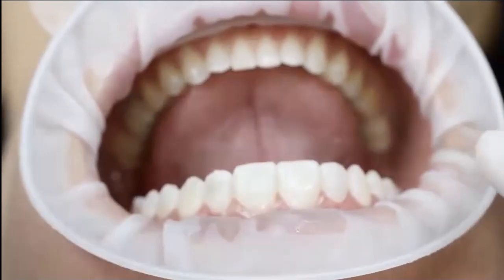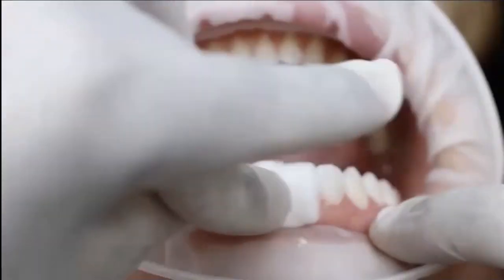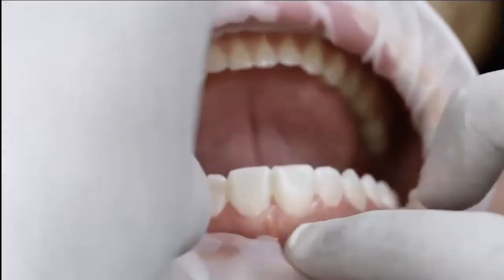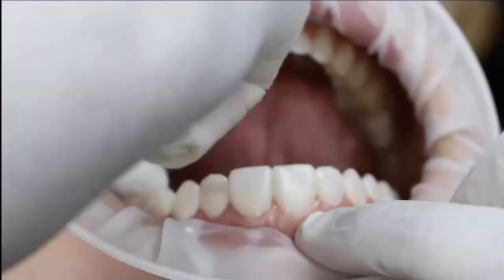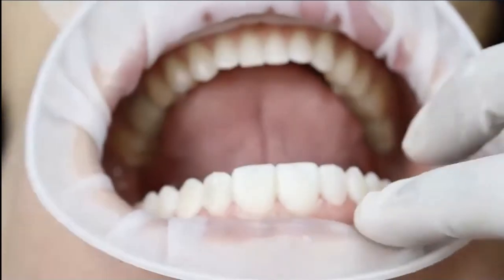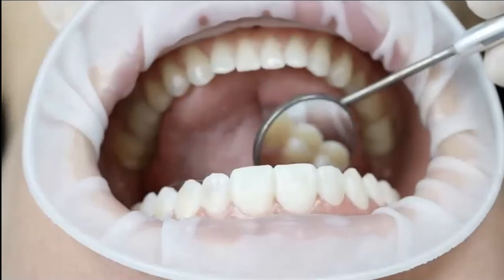Notice the naturality of the 3D wax-up that was created. In this case, let's pretend that it was created by you, the dentist, following the facially generated treatment, and then selecting natural teeth shape. Look at the line of angles and all the morphology that is already in that dental wax-up, already available for you to use.